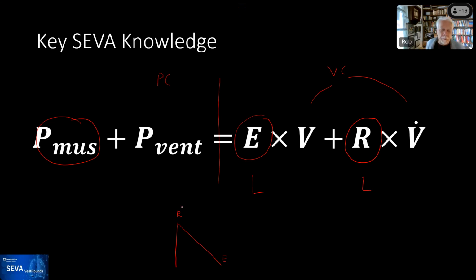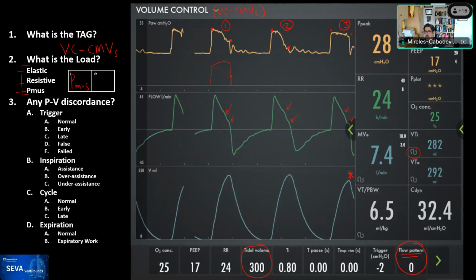So the pressure waveform will start off with a high jump up, and then it'll be curvy in the middle, and at the end, it'll be some other pressure. So that is essentially plateau pressure at the end and resistive pressure at the beginning, or elastic load and resistive load. That is one side benefit of setting the ventilator with the descending ramp flow where it goes down to 0. I don't know how many other benefits there are, but that's one in terms of waveform interpretation. Excellent. My God, we're squeezing this orange so well.